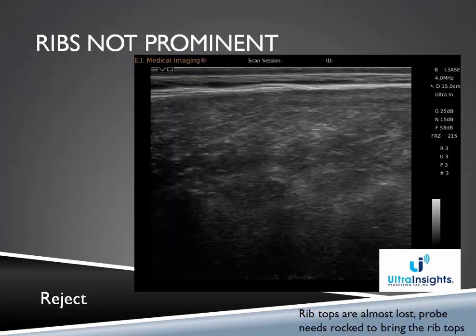Now here's one that I would reject because I would argue that it would be very difficult to tell where any of the ribs are for sure, or how high up they go. So if we put the box here and process it, we can get a value, but is it an accurate value? And depending on where we place the box, it's very possible that we're going to get a rib into it. So this image should not be processed. It should be rejected and no data reported.